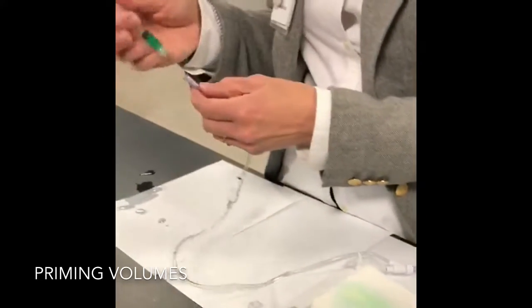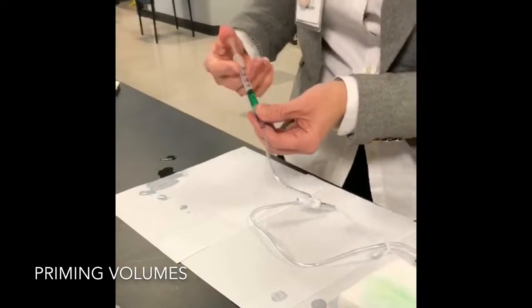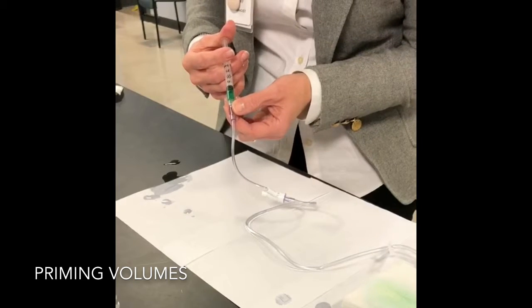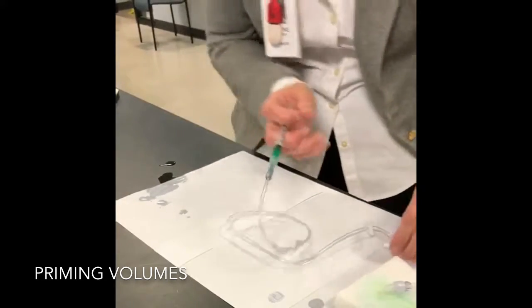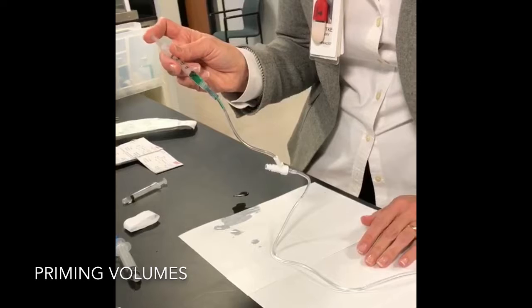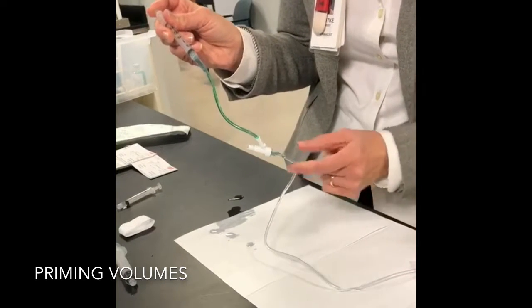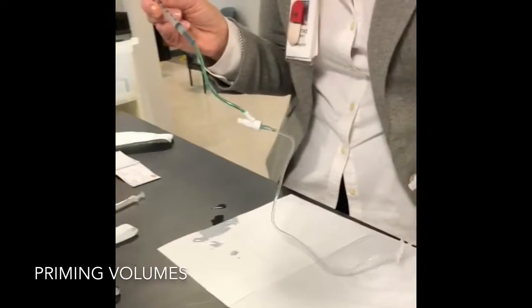I guess I have to put it over here. When you give a drug in here, and again, the green shows you actual drug. When you give a drug, and I drew up 1 mil. Let me take the clamp off of this, put it on here so we don't leak all over. So if I give 1 mil, look how far that drug has gone. Clearly, if this is attached to the patient, the drug has not reached the patient.